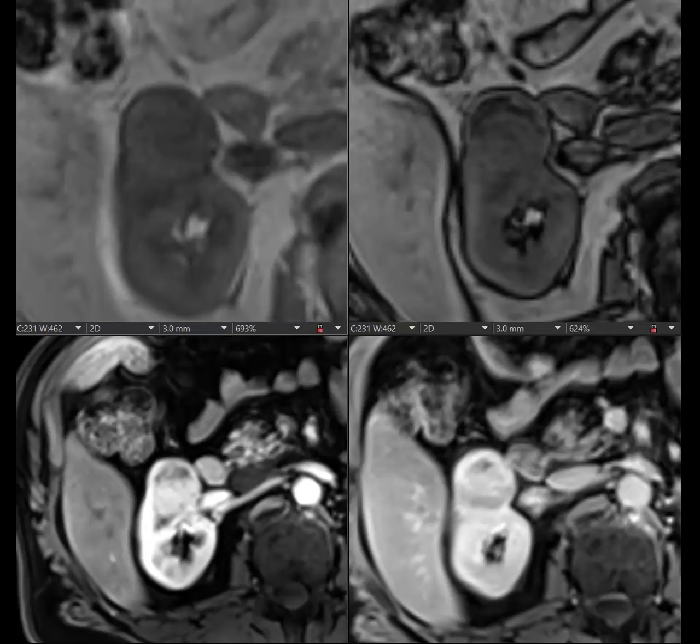Okay, great. So this was biopsied, and there were no features of clear cell per biopsy, and the differential diagnosis per our pathologist was an oncocytoma, which makes sense with this segmental inversion, a chromophobe RCC, among others. Features of clear cell RCC are not present. I didn't see this initially, but I guess that makes sense now with the path results from the biopsy. And I didn't know that oncocytomas can have intralesional fat.